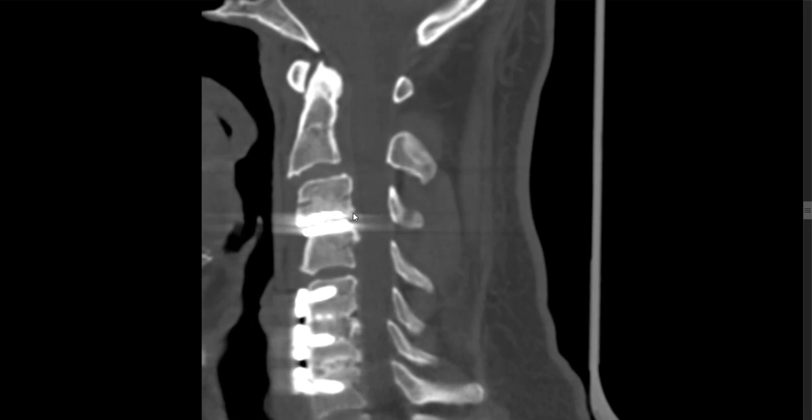The first thing we see with this could be segment disease from the fusion, and I'm betting that it's not, that this was there before, that this disc here where they put the ADR, that there was a problem already at C2-3, only because if this was fused, then there would be excessive movement at C2-3.